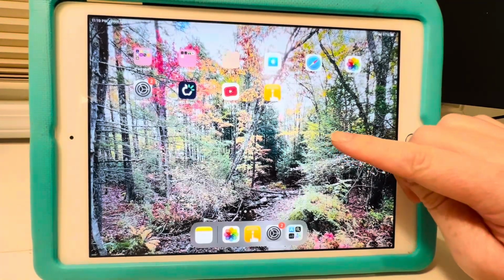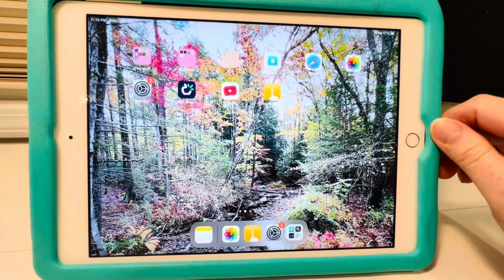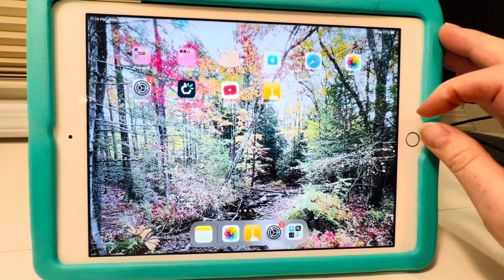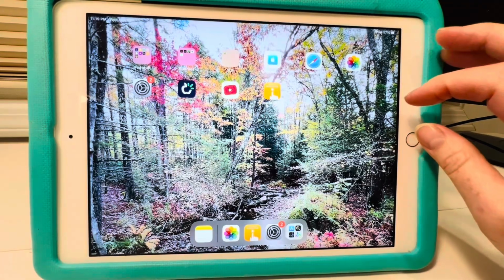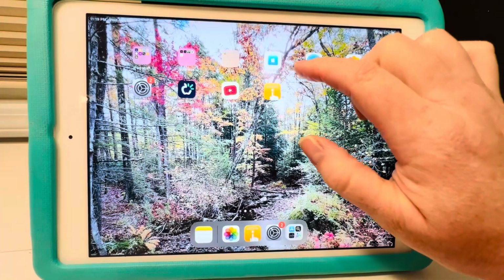The previous videos that I've made, I've done different therapy videos, but the previous speech generating device software that I've done was Snap Core. Today I wanted to get into showing you a little bit about Touch Chat. This is the icon here, Touch Chat DS.